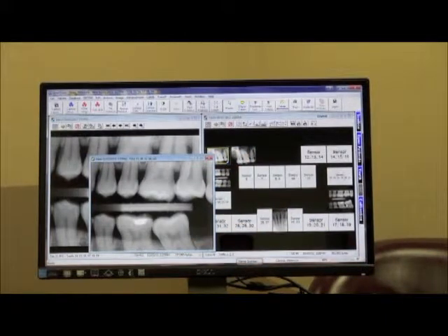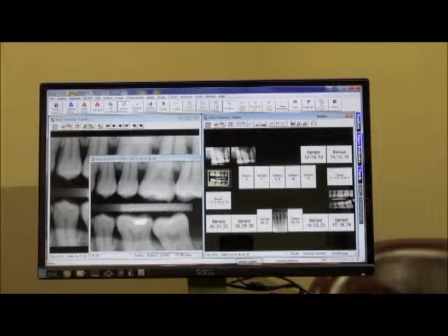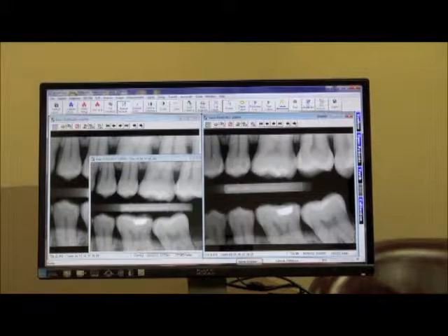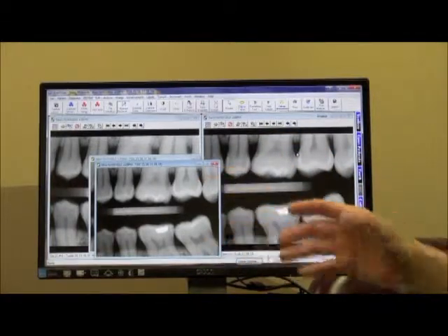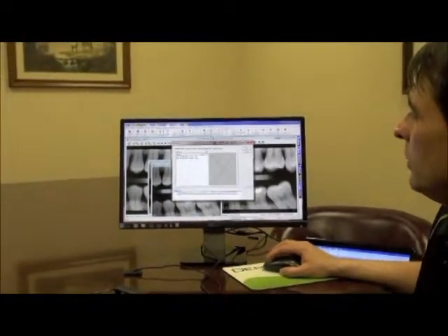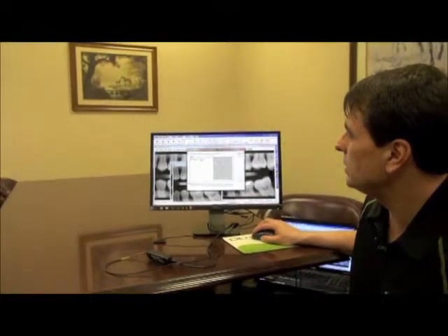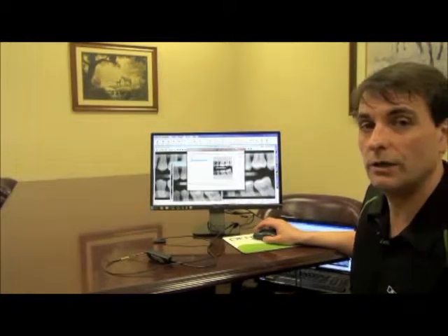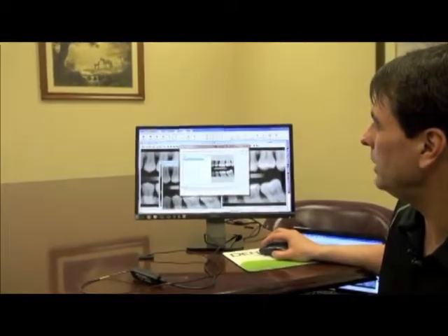Then we choose the image from the second layout, and here we'll choose the same image, and we hit duplicate, and again it's copied out as an individual image. From here we can click on print multiple. Now when we click on print multiple, you'll notice it's only showing us the two images that are individual images currently. We can highlight and it will show the order, 1 and 2.